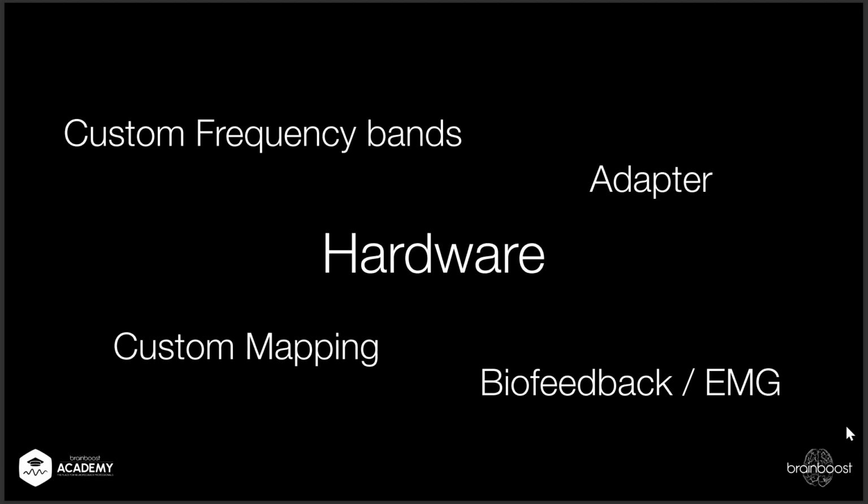So let's go. Now, today it's gonna be mainly a lot about custom frequency bands. It's gonna be depending on your hardware, also about custom mapping. I will explain what that means. And also a lot of people ask me about EMG, so biofeedback with measuring your muscle tension, and some hardware require an adapter. So I will address that in the webinar.